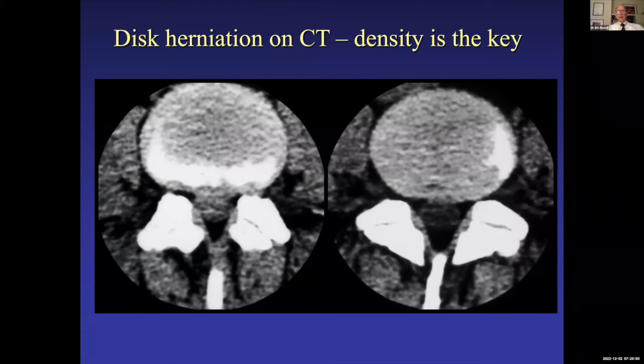On the other hand, midline herniations may be a little harder. We do have the normal level on the right, the abnormal level on the left, and you can see how dark the thecal sac is on the normal level on the right. It's not as dark at the abnormal level on the left because there's disc material that's herniated in the midline. So you don't have a clue that the epidural fat is displaced on one side. So on CT, these are tougher to distinguish unless you're looking from one level to the other, and then you can tell what's going on.